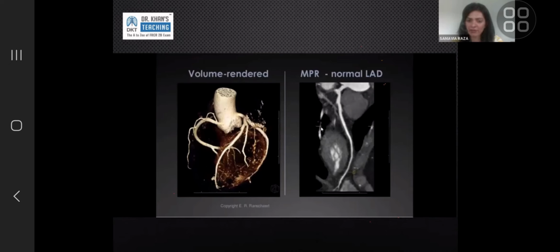You have to take the cursor. You can barely see the yellow one. You can carry it up and down. You carry the cursor down, and on the side you will get a cross section or a circular view through that vessel. So, for example, if there is a plaque here, I'll show you on a later slice. You can bring it down, and on the circle you will be able to see how much the degree of stenosis is. And the cross sectional image next to it is what you will use to quantify the degree of stenosis.